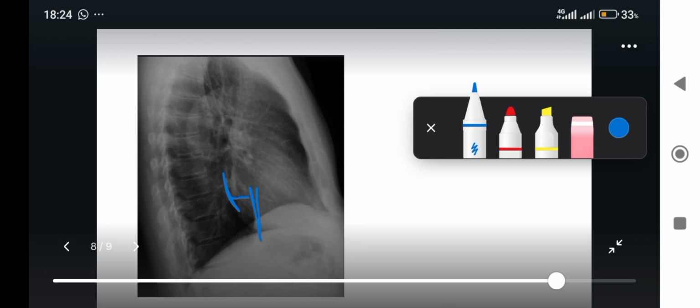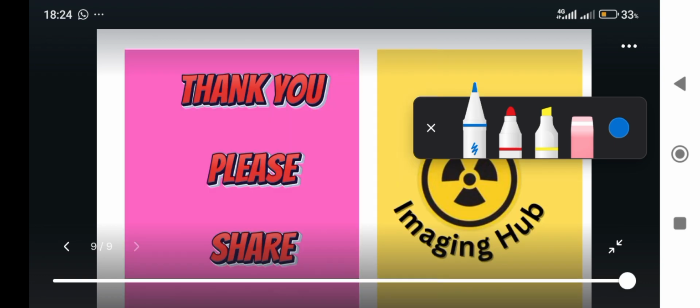If the distance between this vertical line and the posterior border of the left ventricular wall is more than 1.9 cm, then it is a sign that implies that there is a left ventricular enlargement.